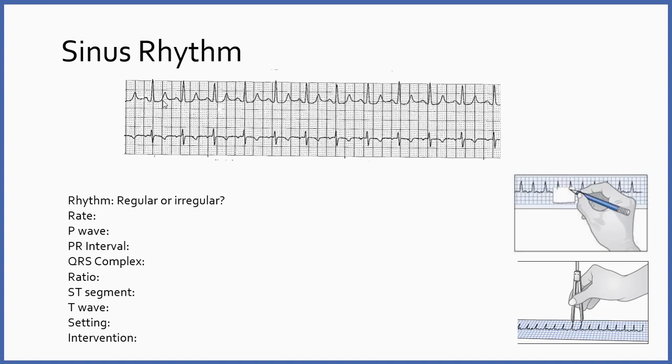Now, notice that if you draw a line to establish baseline, you see that in the upper lead, the ST segment is depressed by about 1 millimeter in depth, 1 baby box. And so let me draw that across so you can see. So like here, here, here, you can see I've got some ST segment depression. But I also see a funny little dip here, and the other thing I notice is that my ST segment in the V lead looks just fine.